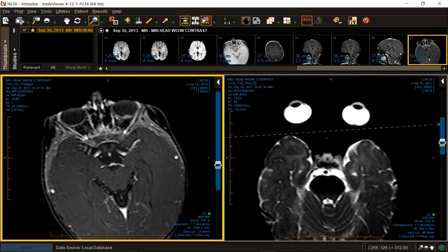Enhancement on the MR. This is a 1-year-old. We said that most retinoblastoma occurs before age 5. Now, if you saw something like this in a 50-year-old, you'd think melanoma. As we mentioned, unilateral, 75%, bilateral, 25%. Our other case was bilateral, so we have to be highly concerned about a germline type of familial retinoblastoma. And tri- and quadrilateral retinoblastoma is 10 to 15% of all familial cases.